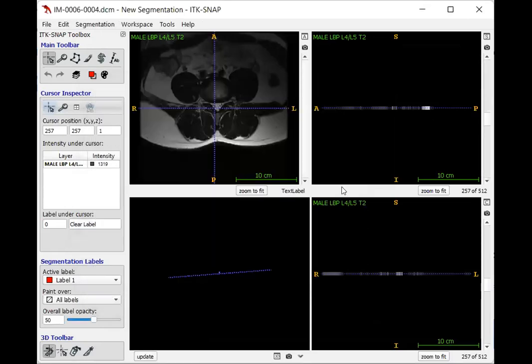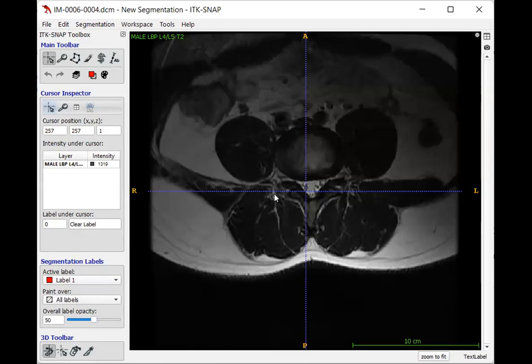So you can see these other three windows here don't really have anything visible in them. These are much more useful when we're looking at a 3D image, which is very common when looking at images of the brain. For our purposes with the 2D images, we can just stick to this first square here. So we can leave the screen as is, or if we just want to look at this one, we can click this square button with the A in it here, and it'll expand the view so it's just this image here. If we want to return to the 4 boxes, we click that button again.